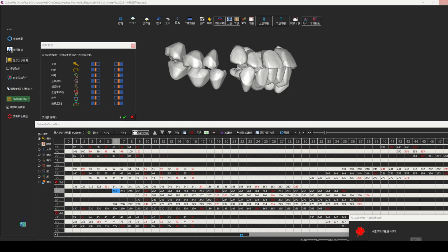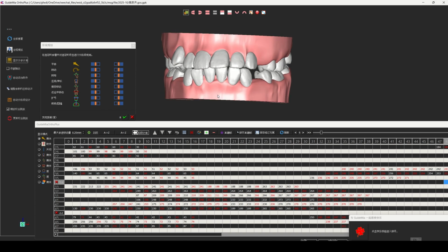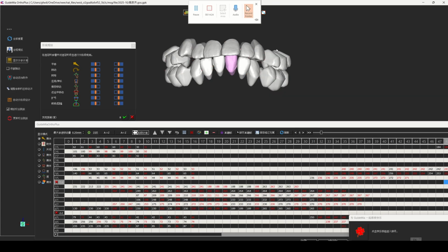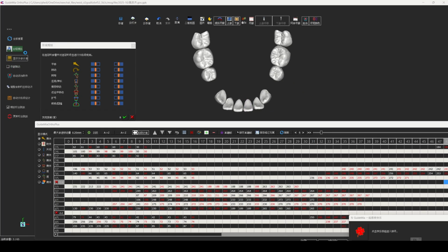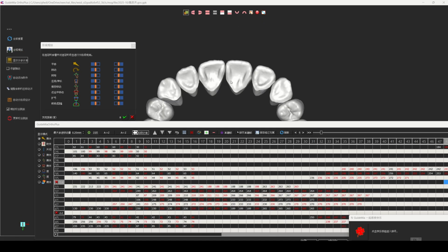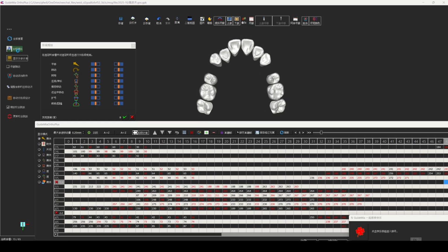And we use add steps, remove steps, and most importantly, we set keyframes for the anterior teeth, and we do keyframe alignment so that we create multiple checkpoints for anterior teeth during the tooth movement course. At those checkpoints, all the anterior teeth are in a good alignment. Now we do a final inspection of the movements.